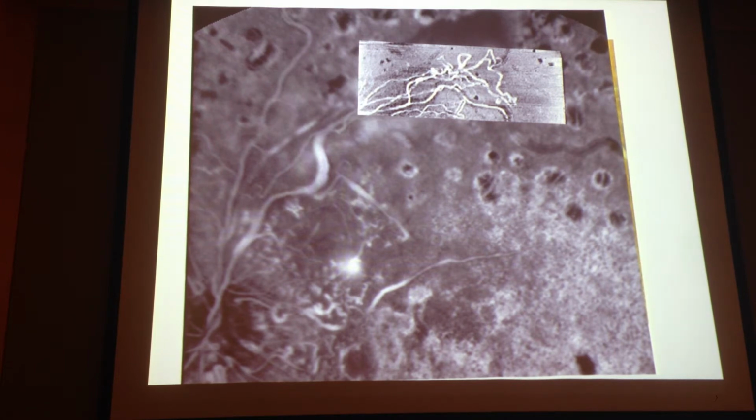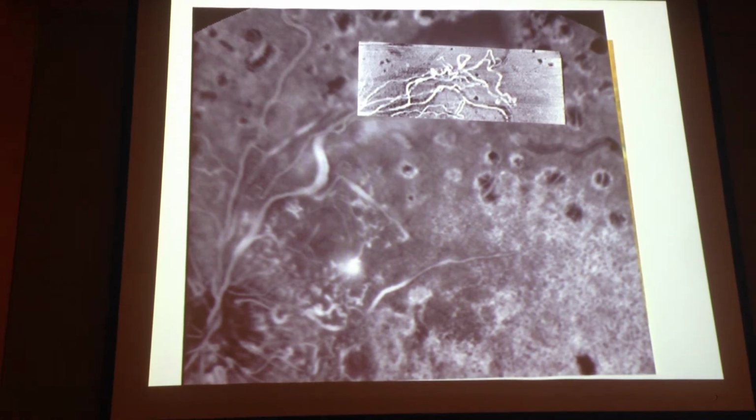The problem is that the size of the vessel is not the anatomical size of the vessel. It's just the lumen of the vessel that we visualize. And in this case, it's extreme, so we actually see the difference between the vessel when we look at the color or fluorescence or any reflective image, and the angio-OCT, where we visualize only the area where something is moving inside.